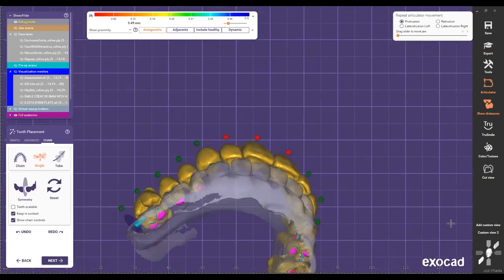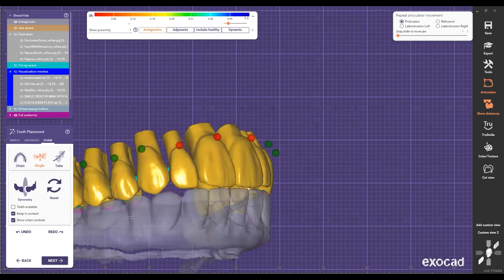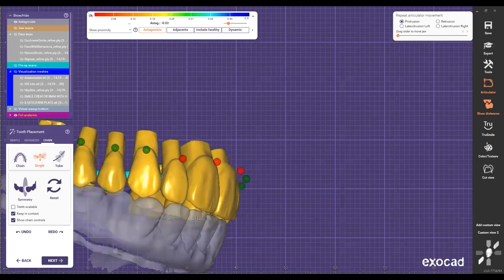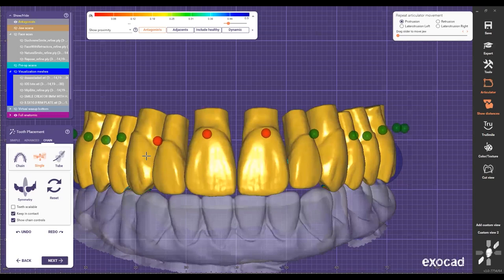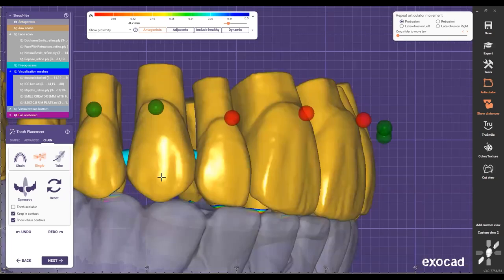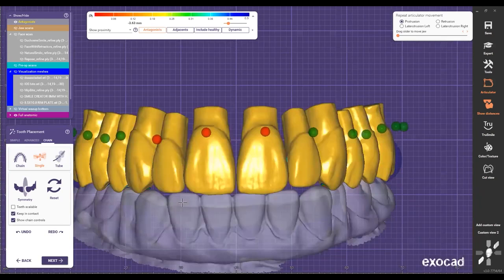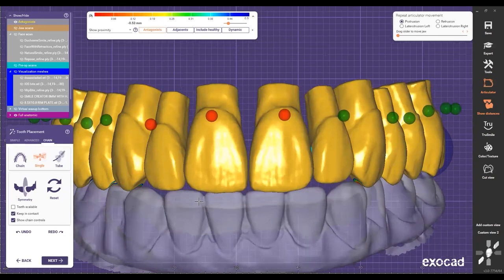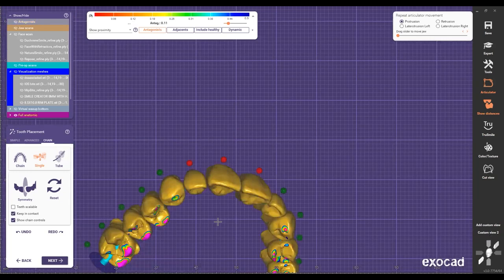So now I put it from the front and I wanna make sure that I kind of hide that distal tooth a little bit. I'm sorry, the distal right here of that tooth, if possible. So now I'm going to keep this one a little bit even or above in this case, because I would like to bring this 0.3 higher than the lateral, but in this case, I want to keep it in occlusion and I don't want to make it bulky because I can see that surface from the front. Okay, so I'm going to have to compromise the aesthetics a little bit there, but I know that I can fix that at the end for the final because I'm going to do upper and lower at the end. So now I have that one already in position, and then I can just go from there.